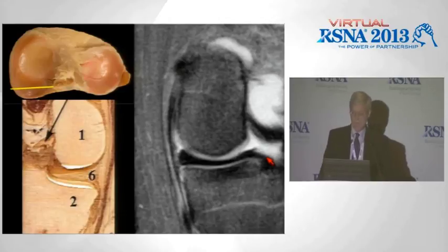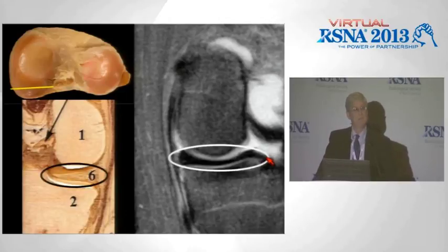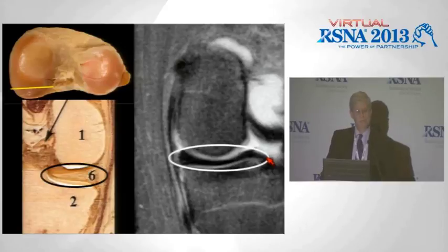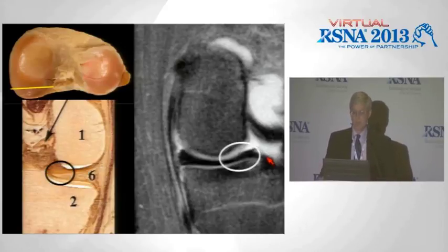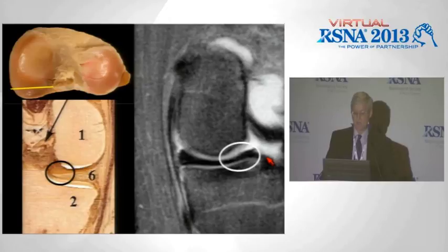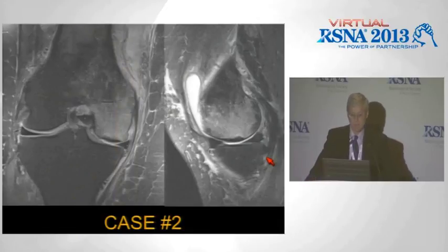If we look coronally, again, we should see that meniscus medially, usually turning down, going toward the base of that spine on our one or two most posterior images, and you can see where you are on your axial gross image and on your coronal image, and then the matched MR image as well. So there is your meniscal root. You should always see one or two images with that appearance most posteriorly.